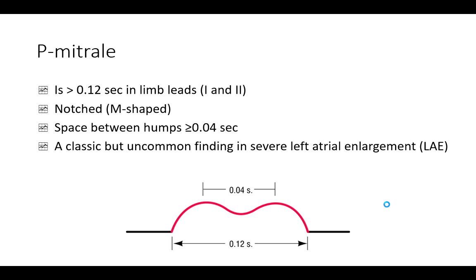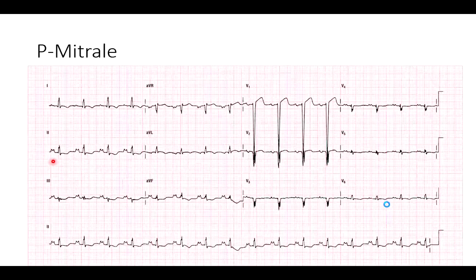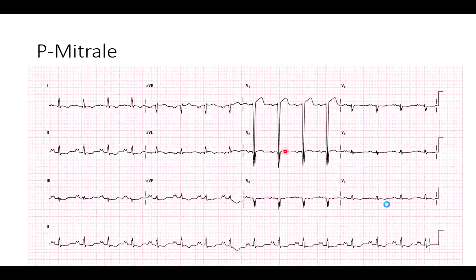So P mitral is one thing. Just looking at the P wave, look at this. Oh, look at the P wave. There it is. Textbook example of P mitral. Look at this. I haven't talked about this yet. Do you see this really large waveform here?